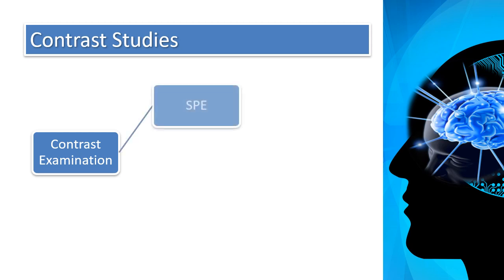Now let us discuss the contrast studies. Contrast studies means that you will inject gadolinium through IV, gadolinium administration. So what sequences are used with the gadolinium administration? Actually, we can use special sequences related to spin echo or special sequences related to the gradient sequence.